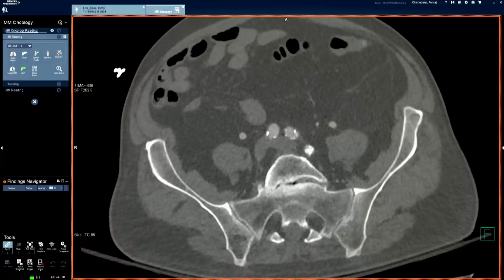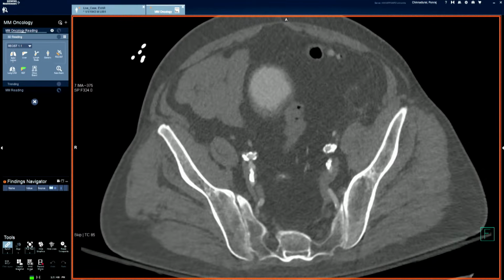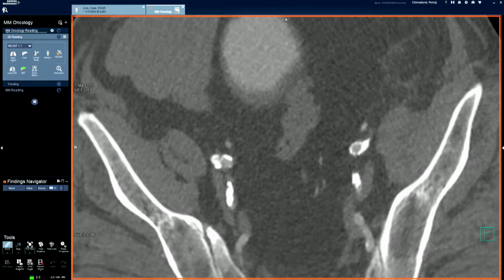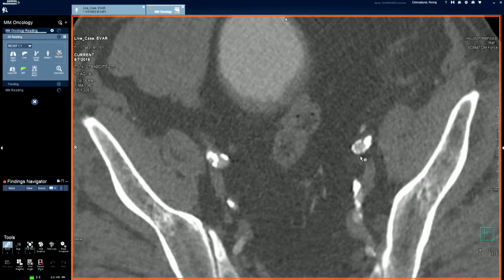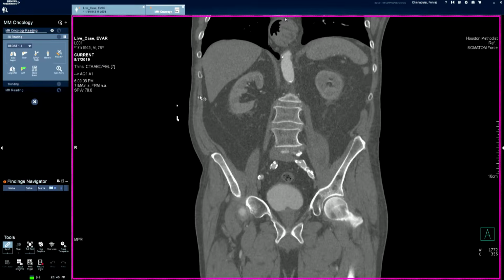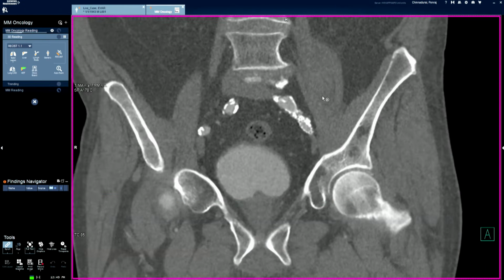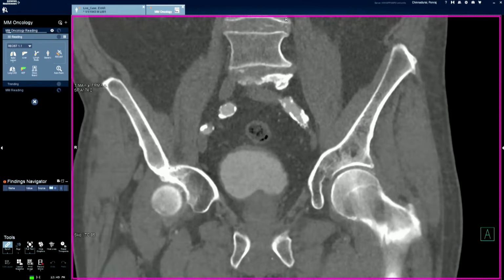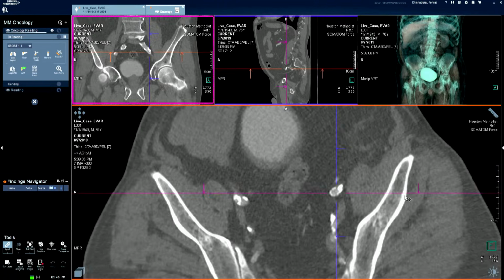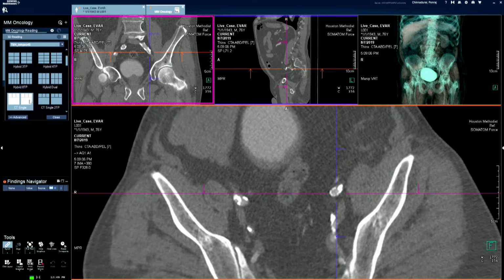So now we are looking at the same axis coming down. This is the thin cut CT. And here you see the difference, right? Not just in axial. For example, here is your stent and the calcification. Now I can bring my crosshair to that stent and show you the coronal image. So you see the stent, right? You're not seeing the entire stent in the same plane. I'm scrolling through, and this is what I call multiplanar reconstruction. Maybe I should keep the layout consistent.